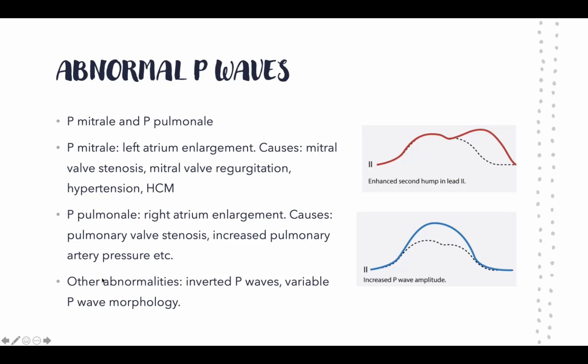Other abnormalities that you can note in P waves, that we'll go into in more detail in future sessions, are that P waves may be inverted or even have variable P wave morphologies as well.